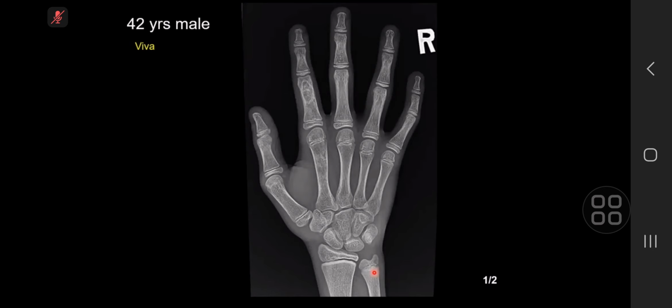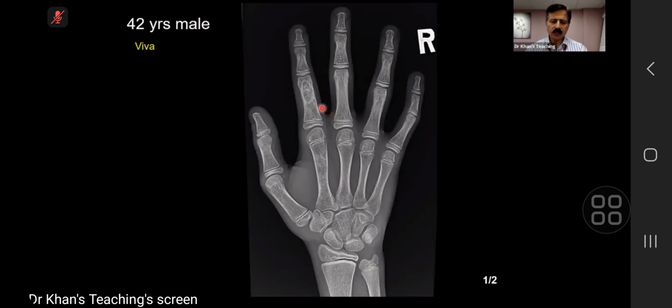I suppose it could be another benign lucent bone lesion, potentially a bone cyst, although I wouldn't expect internal matrix in that case. Excellent. Okay, I'll take over. Well done. So if you see this lesion, there is basically a lytic lesion, right? And a lytic lesion which has got a narrow zone of transition, and the differential diagnosis can be quite extensive, many things can be considered.